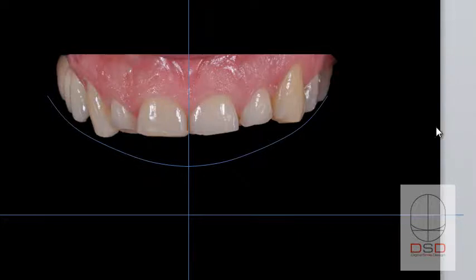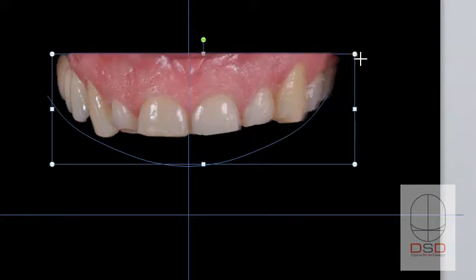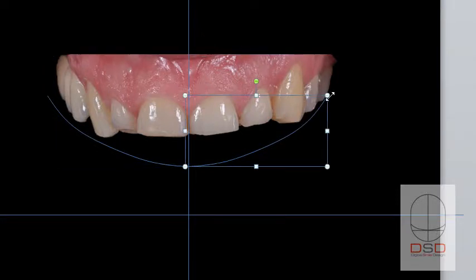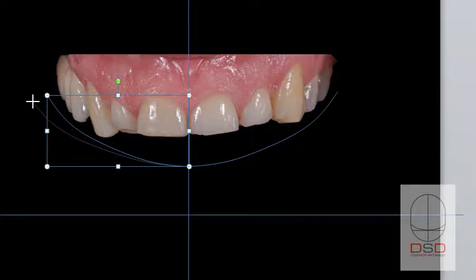Okay, so I can see that on this I would have to open a little bit, sorry, I will have to open a little bit this curve, and the curve that I'm going to open a little bit, I'm just adjusting to get a more realistic design. Now you can change this at any time. You can change this curve at any time.